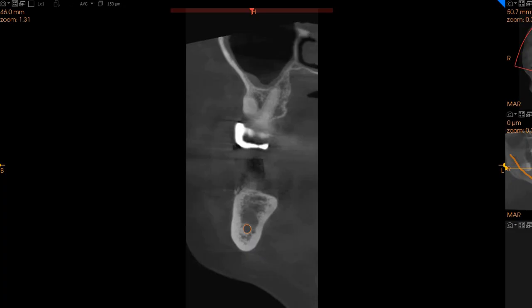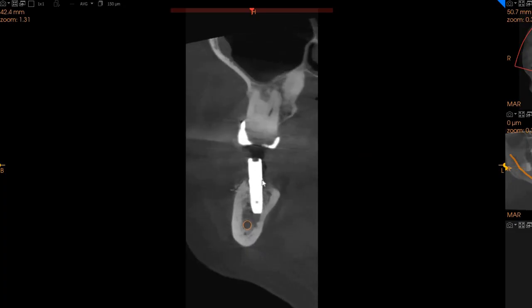And finally, the implant on the distal right side, again, very severe bone loss here. Approximate bone loss is about 4.5 millimeters on the lingual and 2.5 millimeters on the buccal aspect. If this implant is extracted, 14 millimeters of ridge width with approximately 10 millimeters of height.